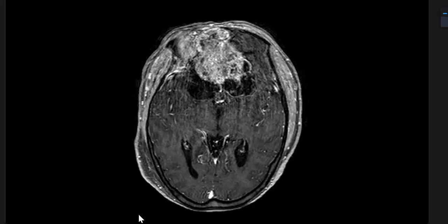But I don't know why you jumped to the diagnosis. Never bring the diagnosis during the explanation. You gave lymphoma and GBM straight away. Why? Because in the exam, if you give it, your mind gets fixated on those diagnoses, and your whole time will be spent justifying those two words you've uttered from your mouth. Once you commit, it's very difficult to backtrack. It's natural psychology: you start defending those two words by trying to fit the findings onto those initial diagnoses which you have already expressed during the observational findings explanation.